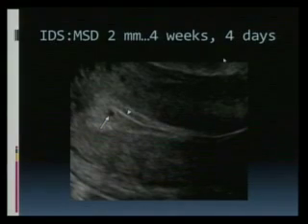Okay, so we'll let the images do the talking. This is the endometrial echo right here. This echogenic line is the endometrial cavity. One very important feature that differentiates a true gestational sac from a pseudo-gestational sac is that the real gestational sac never occurs in the center of the endometrium. It always occurs eccentrically. Have you all heard of that before?